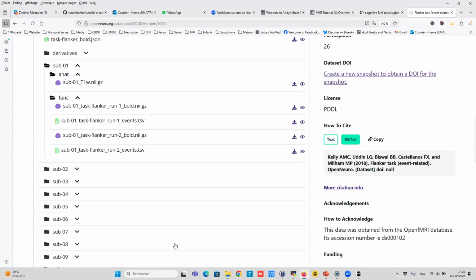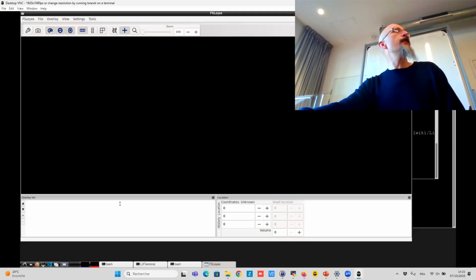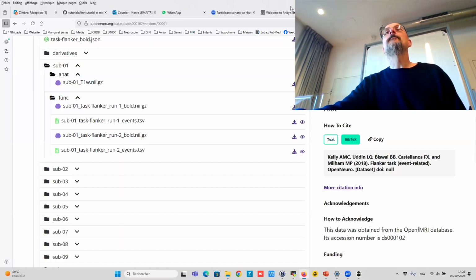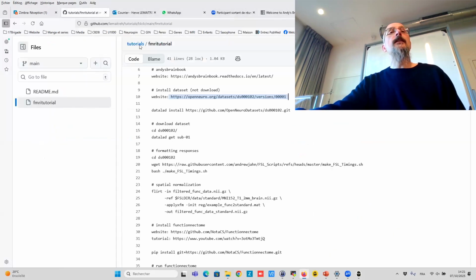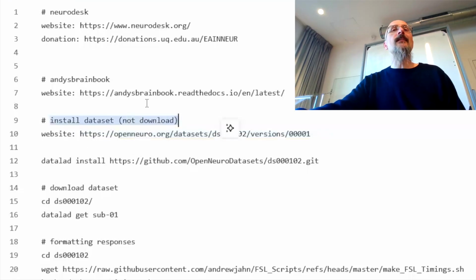So now it's the part where you go to Neurodesk. Normally FSLeyes should be open now after a long time. Okay, we'll see what we can do. There is a link, I can show you again. Here there is a line called install dataset, not download, and below you have the website.